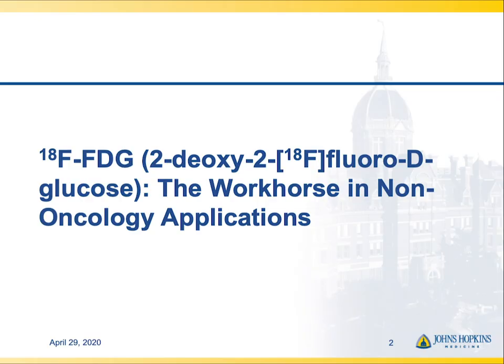So starting with FDG. I guess you could say the strength of FDG is that it's useful in so many things, but of course the weakness can also be that it's useful in so many things. So there does tend to be a non-specificity to FDG uptake. And here we're going to examine some of the uses that we can put that non-specificity to outside of cancer.